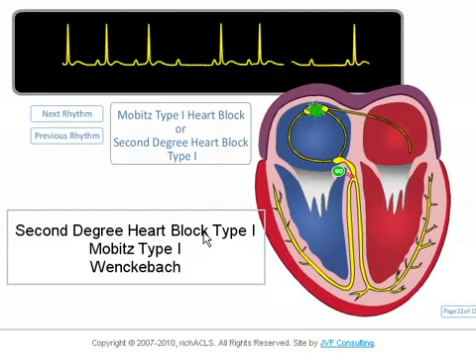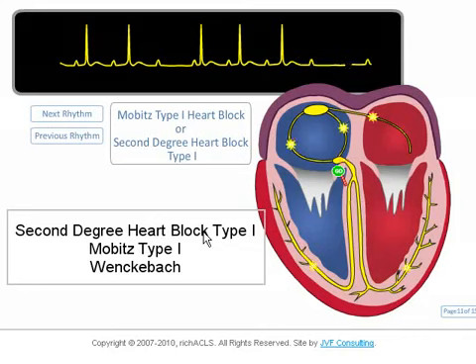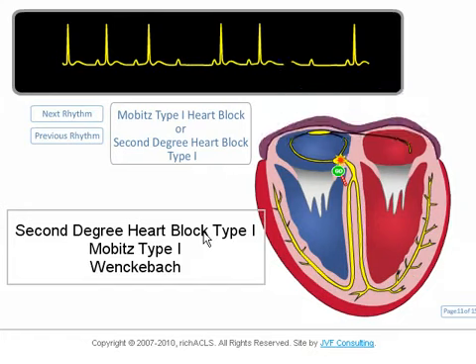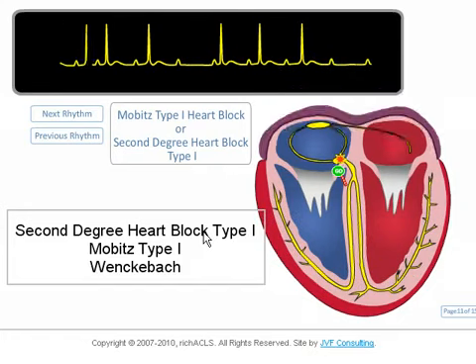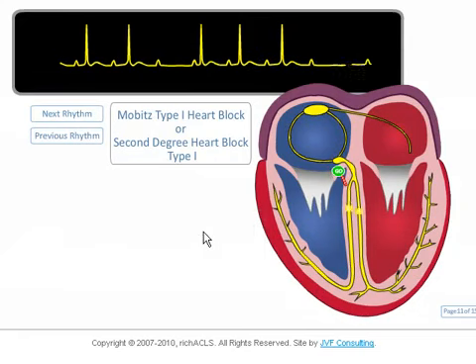The analogy shows the AV node is diseased, it gets tired quickly and can't do its work, and after a short period of rest it can pick up and conduct the impulses down again. Other than the AV node needing an occasional rest, the conduction process is normal.